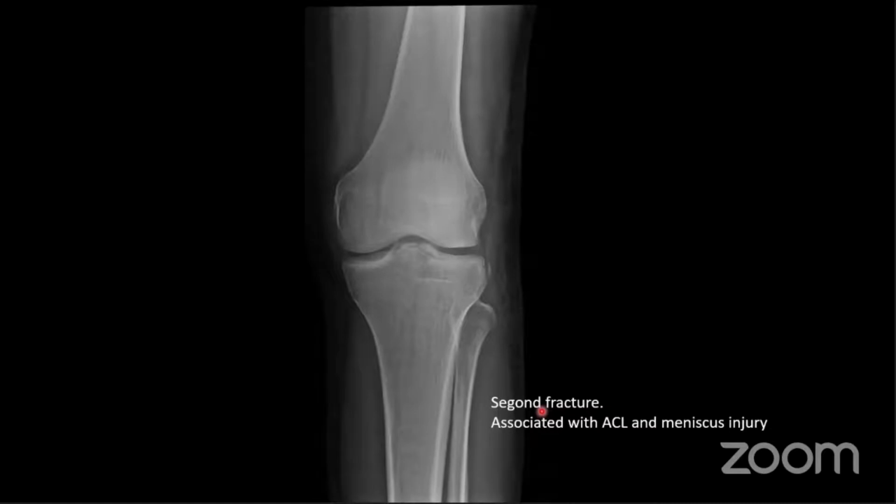Is there a white fracture line on the tibia neck? Are you talking about this line here? Or that line here? Here, you mean? Or here. I think this is just the outline of the fibula behind the tibia.